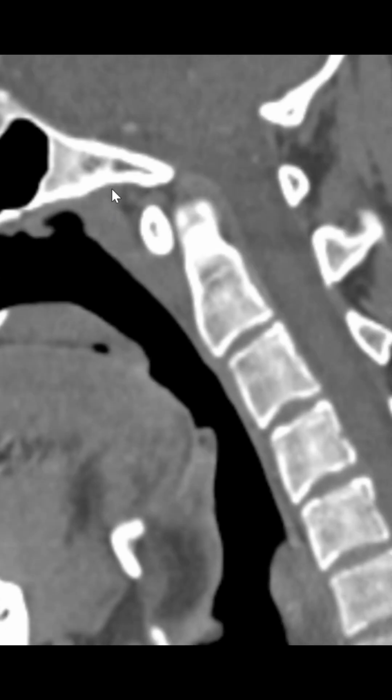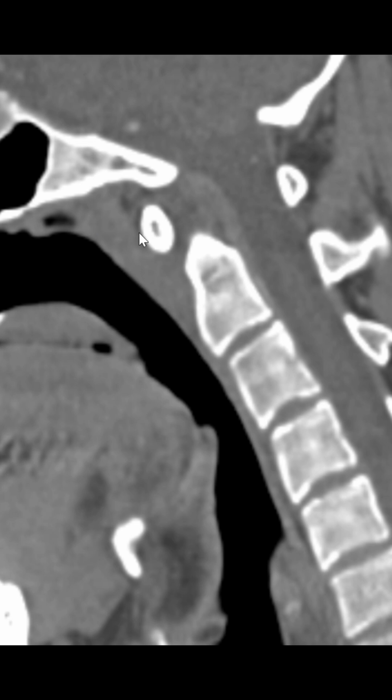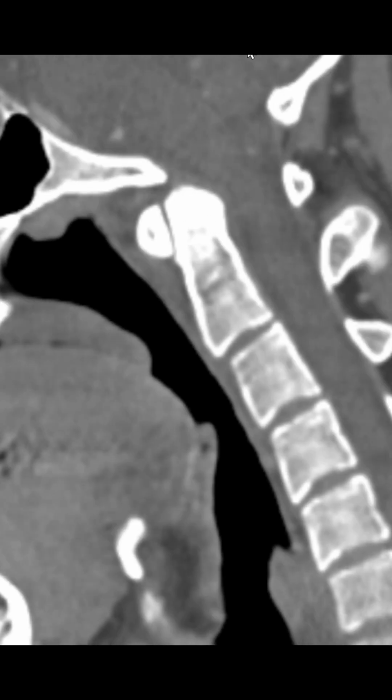But you can see that the angle slope of the clivus is fine here, but outside of the visibility of the dens. So in cases like this, you'll have to just follow the dural path the best you can. Usually the top bump of the clivus here is going to be your angle.